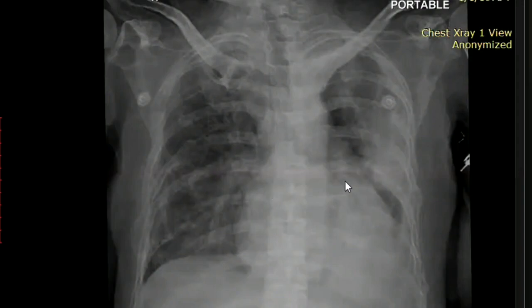Okay, so yes, some of the examiners only show X-rays, so you will say that these are lytic lesions here, and also in the scapula here, and you can see the multiple punched out lucencies, so you will say metastasis, less likely multiple myeloma as the lesions are too big, and the approach was fine. The lung definitely is abnormal, maybe lung mass with metastasis, so fine, not bad.